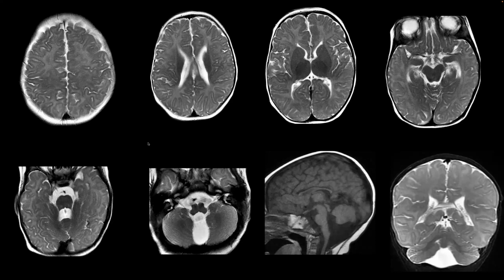So, MRI at 4 months of age, and you can appreciate straight away there is a reduction in the periventricular white matter volume. You can see there is some scalloping of the lateral ventricles. The corpus callosum is thin. You can better appreciate that on the coronal and sagittal sequences. There's also a degree of pontocerebellar hypoplasia, particularly the inferior cerebellar hemispheres. The vermis is hypoplastic. Also, the pons itself is demonstrating some degree of hypoplasia.